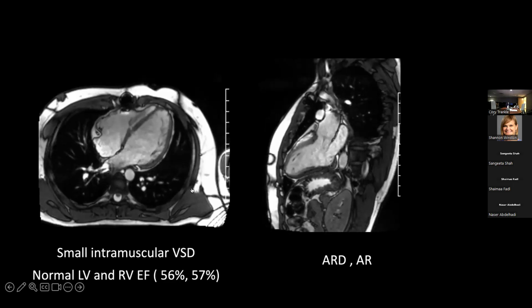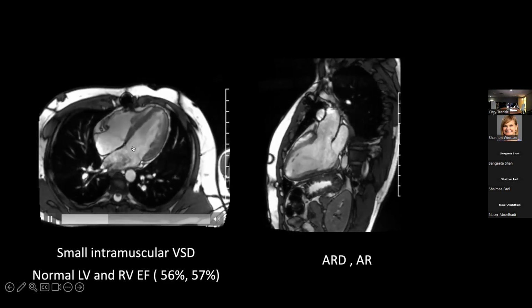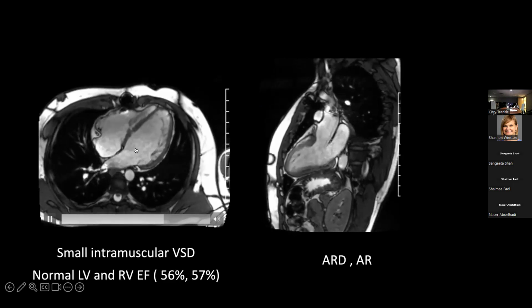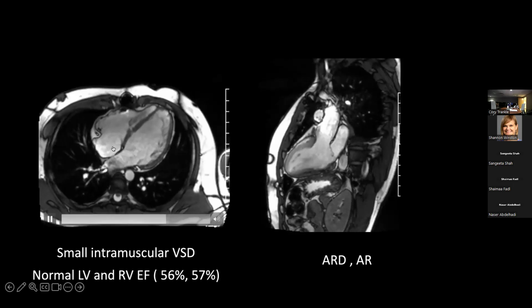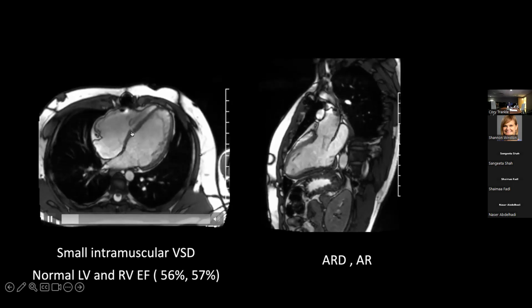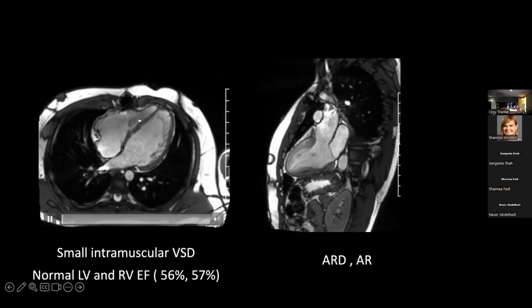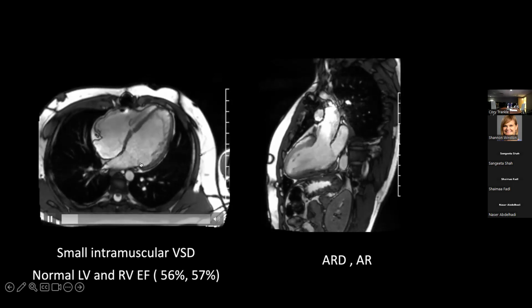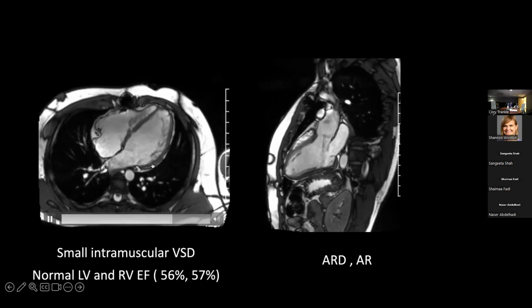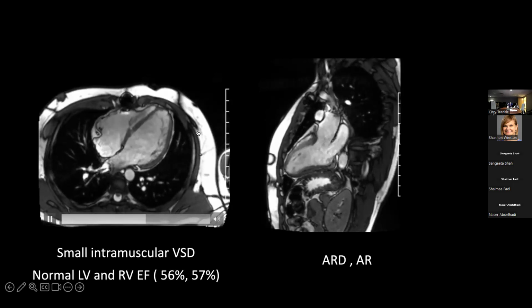This is her cine images. You will see that it is not like the atrial switch procedure. This is very close to the normal anatomy that we see in every cardiac MRI patient. This is the 4-chamber view. There is a small defect at the interventricular septum, likely a small intramuscular VSD. The function was normal in this patient. The LV function was 56%. The RV function was 57%.